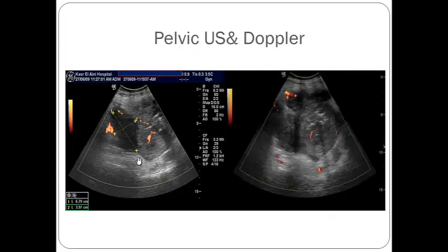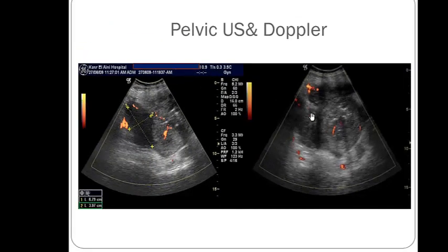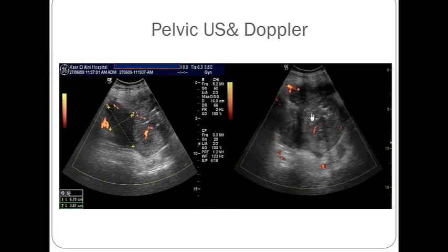Okay, pyometra. And this is the adnexal region, and here there is a solid component present inside. There is air here. But here is a solid mass with vascularity. So again, Doppler is mandatory in these cases in order to exclude that it is infection superimposed on a malignant lesion. There is a malignant lesion with superimposed infection.